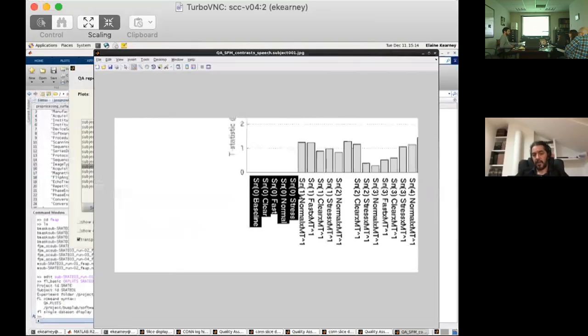By default, if you don't specify it manually, then it's going to use the assumption that anything that you're going to look at in terms of your contrasts are the things that you care about, and those are the things that are going to be session invariant, and everything else is not. But that's just a guess. I mean, it's doing a best possible scenario guess in the lack of information. But the best thing would be for you to provide explicitly, as a list, which things you actually want to be session invariant. Makes sense?